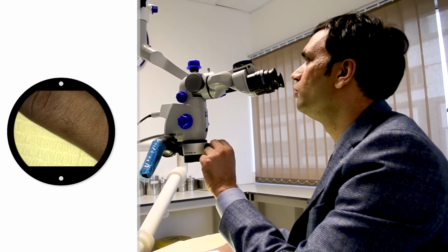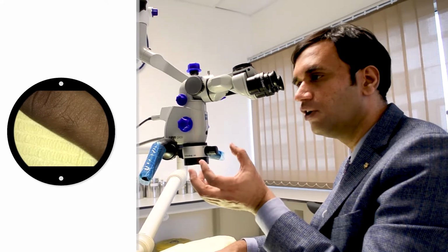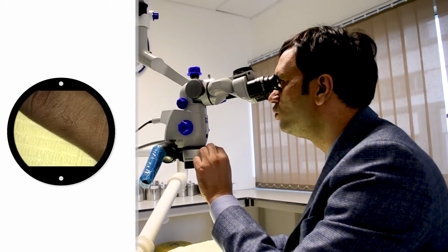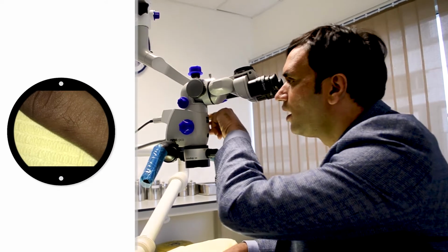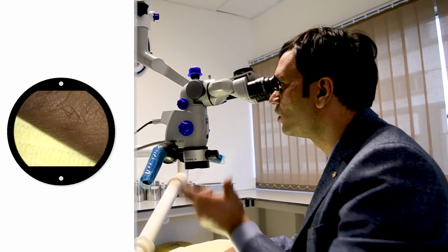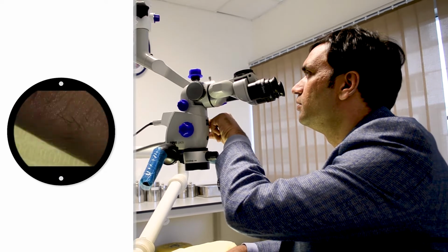So what happens is, when you move from smaller magnification to larger magnification, there might be finer adjustments you may have to make, because the focus at that magnification is changing a bit. Now you can still focus on my hair on my finger. Now you can see at a higher magnification. Let me move to 1. You can still see that the focus is not changed, and I don't require a fine tuning for this, right? You can see that it is still maintained in the focus.